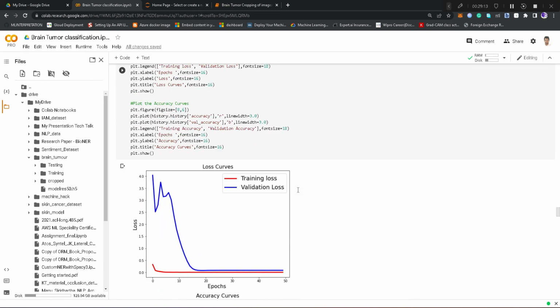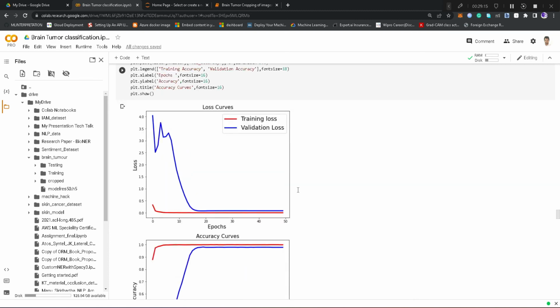Now, as you can see, this is the training curve, showing how the loss started getting reduced. Initially, from 0 to, let's say, 2, 3, 4 epochs, it reduces constantly, then again it increases, then again it reduces, then slightly increases, and after 10 epochs it started showing a declining nature, and it declined a lot.